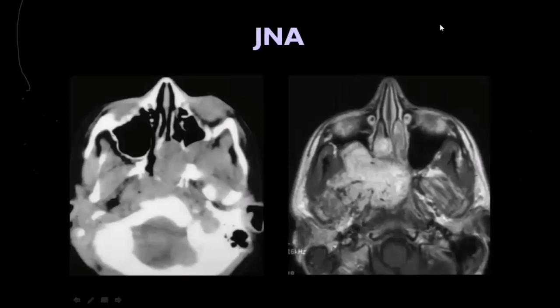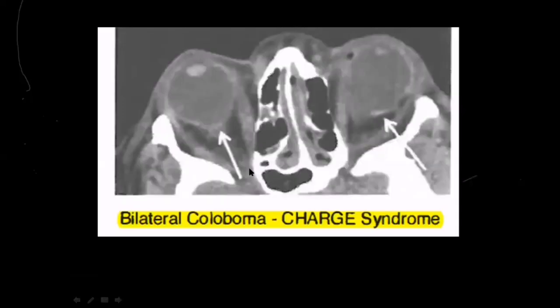Exactly, adolescent boy, Dr. Naufal, exactly. So juvenile angiofibroma is one of the important ones, and they like it in the exam, so don't forget it, please, because in every exam maybe you will have something similar. Sometimes you can see something incidental like this when you find coloboma, which is like a conical extension of the eye sclera. So don't forget something like this. And they like it because it's linked to something called CHARGE syndrome. Coloboma, and I think it involves the heart and ear and many things, as I remember.